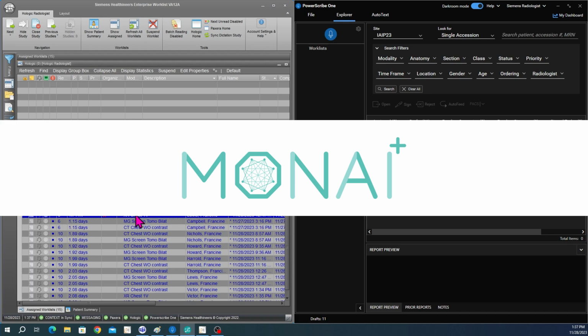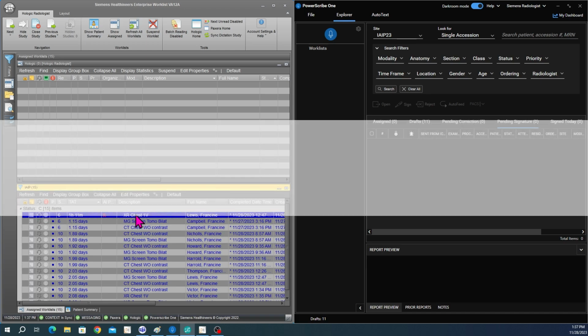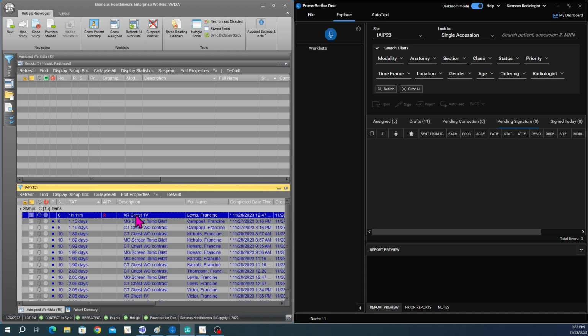Before we review the study, a quick note on MONAI. MONAI is an open-source framework supported by NVIDIA in collaboration with several institutions, including King's College London, Mount Sinai, and the Mayo Clinic. MONAI is specifically designed for building and deploying medical AI applications.